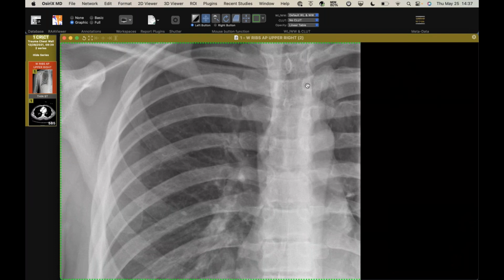That's one of the things I always look for on the trauma radiographs. Usually one of these is either too far over or it's elevated, because when that capsule is injured, the muscles will elevate the clavicular head. You just see a very subtle elevation. So I would call this a retrospective finding. I would not call that prospectively.